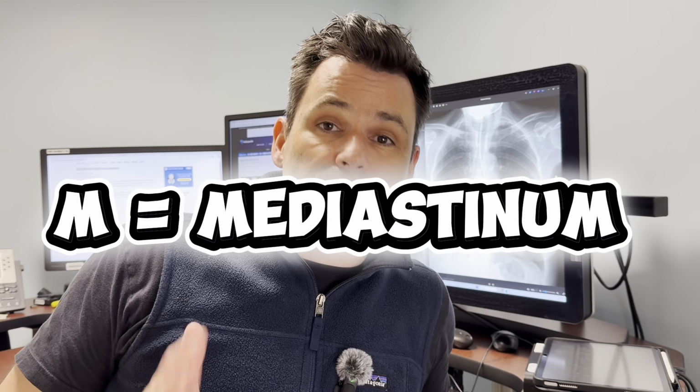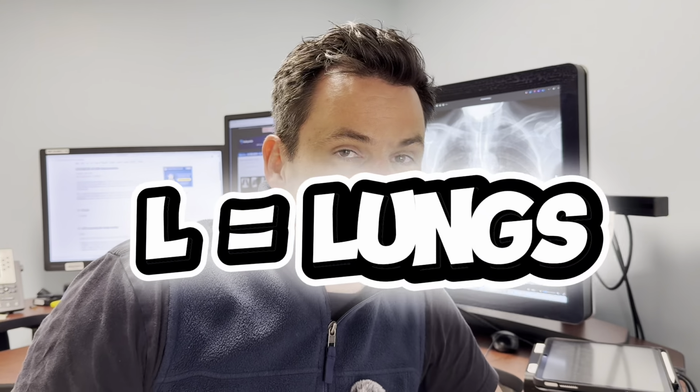Next up in your search pattern is M, and M stands for mediastinum. The mediastinum is anything but simple. There are all different kinds of structures that run through the mediastinum that can be assessed on a chest x-ray. Looking at the mediastinum includes looking at the cardiac silhouette and the retrocardiac space, the mediastinal structures, the aorta, and the trachea. Last but not least, L stands for lungs.